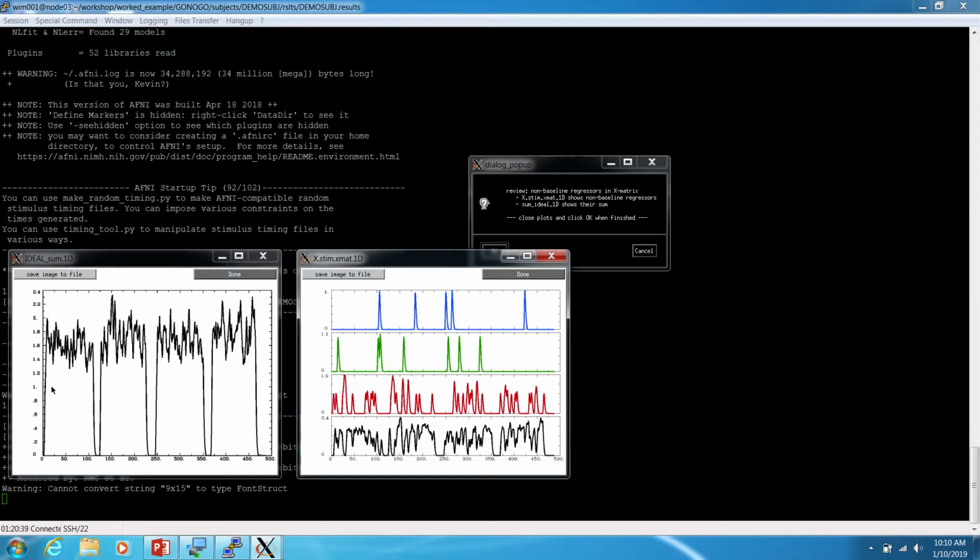What ideal sum shows us is the sum of all of this. So it gets broken up, but this basically shows throughout the time course of your event how much of all of the images that we recorded are counting towards your experiment, basically. And what you want to see is not a lot of things at 0. You want some things at 0. And you'll notice, again, these correspond to gaps between our runs here. And then what you want to see is a lot of stuff that's above 1 with a lot of spikes and variation.